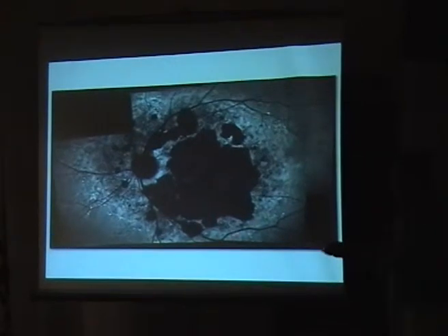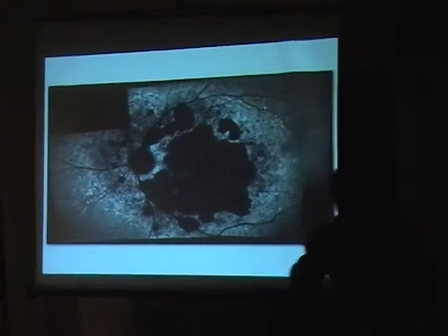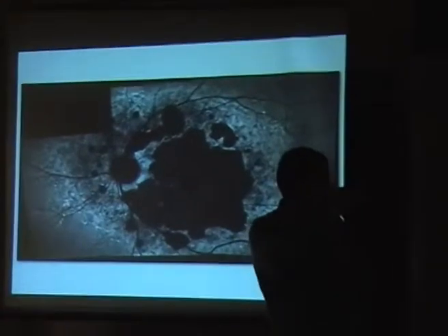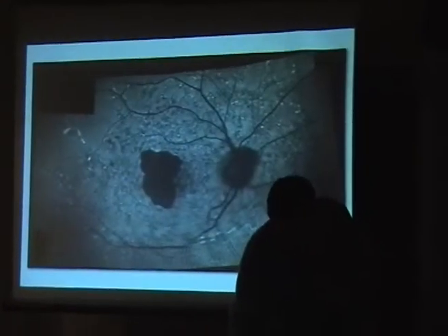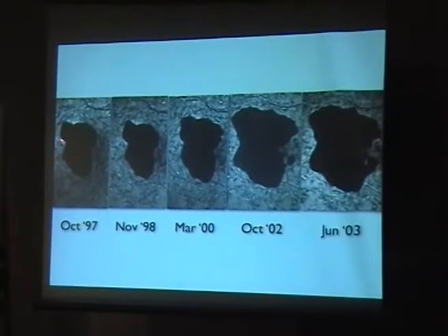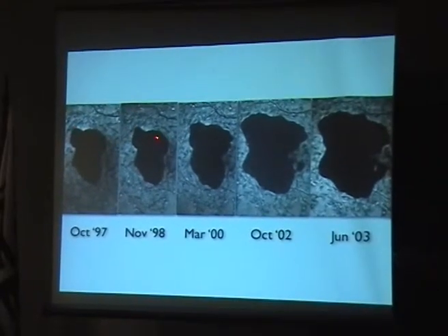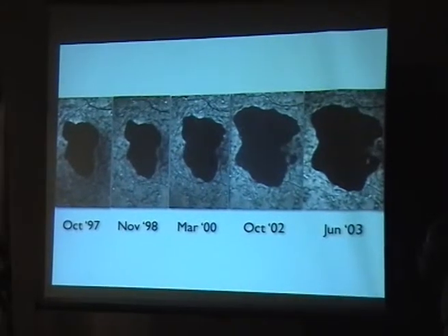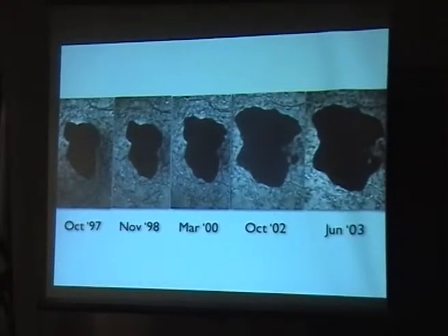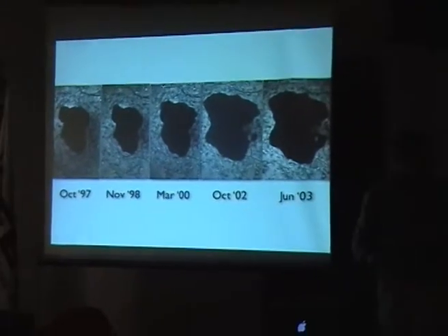And this is another Stargardt patient where you see all the increased fluorescence here that seems to announce the new area of atrophy. And just looking at this patient, you see that where fluorescence increased, you have an increase of atrophy. We don't know exactly how long it takes to have increased autofluorescence before the atrophy appears, but for sure it's a sign.